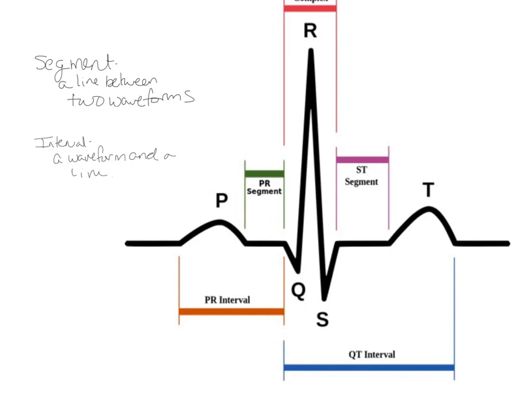All right, so those are going to be our intervals and our segments, guys. We're going to be measuring those and looking at deviations like abnormal ST segments, prolonged PR intervals, prolonged QTs, or short QT intervals. All right, so remember these because they are huge things to know.